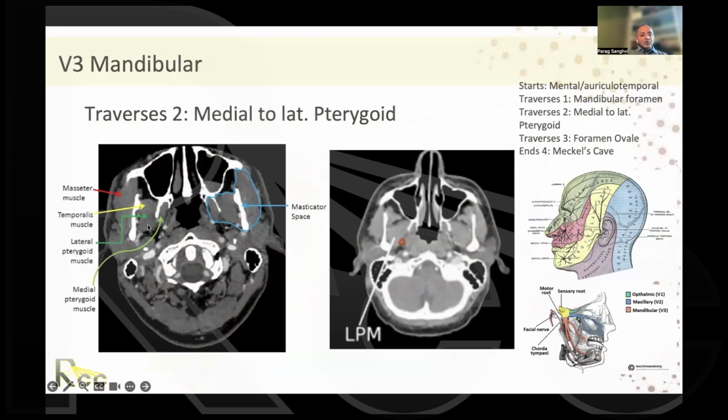And one of the things that you can see sometimes in these patients is that if you have gross PNI, it'll actually invade into the pterygoid musculature and then sometimes spread right into the masticator space. So I don't routinely electively treat this, but sometimes with patients with gross disease, you will see that they have significant trismus because the tumor is going right into the pterygoid musculature and can have masticator space involvement in these patients.